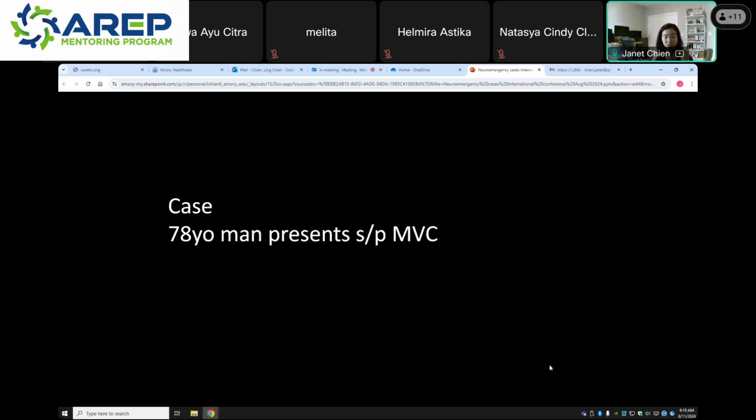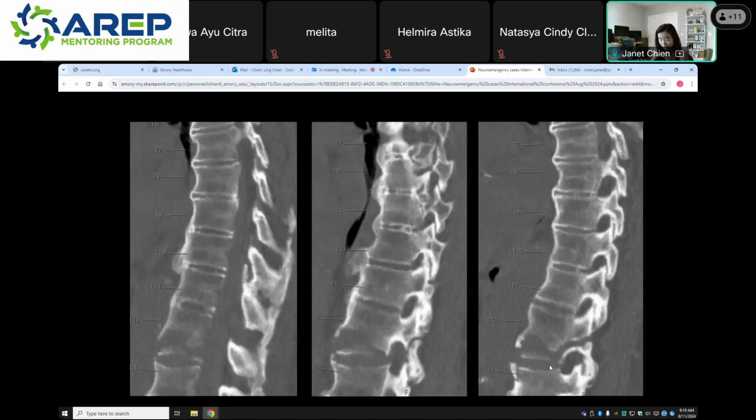All right, next case is a 78-year-old man who presents after motor vehicle accident. I'll give you some time to look at this set of images.